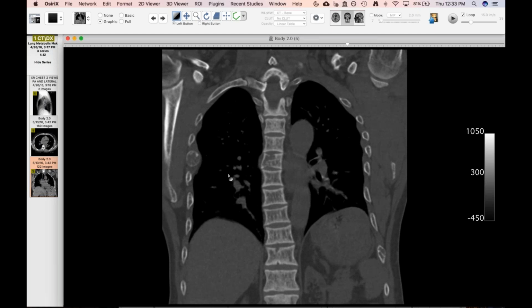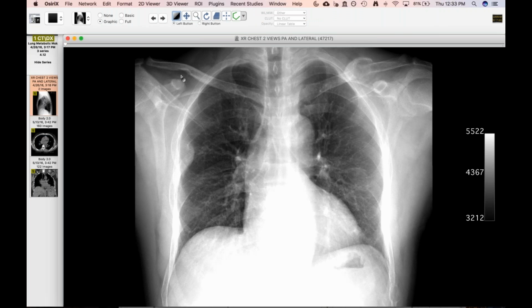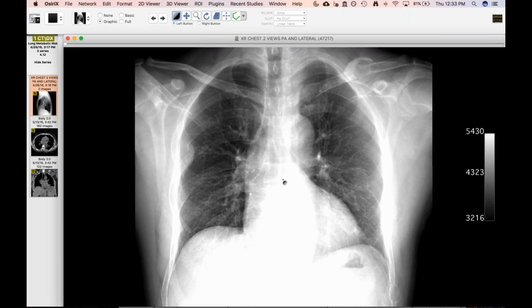I love it. But yeah, I thought, especially with some of those other findings, I forgot the acromioclavicular or the coracoclavicular ligament, I guess is what's right there. Yeah, you've commented on that in the past. So, Travis, do you think that was a pathologic fracture on the left at the coracoclavicular joint?